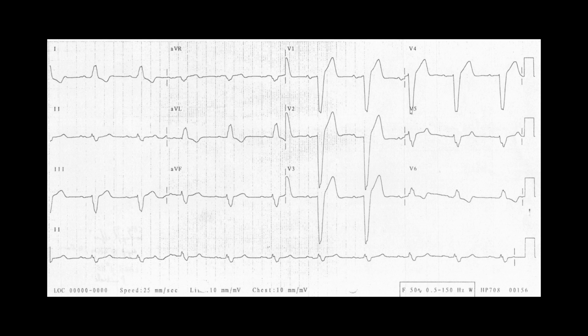This is a normal left bundle. The patient has a left axis, just about. Also something that I would predict. When I look for the ST elevation, I see it in V1, V2, V3, and V4. So I need to measure it because it's going with the T wave. If any part of it was greater than 25% the depth of the QRS, then I would be concerned. Or if the ST segment was going with the QRS complex, I would also be concerned. So if in V1, V2, V3, or V4 I saw some ST depression, that would be concerning.